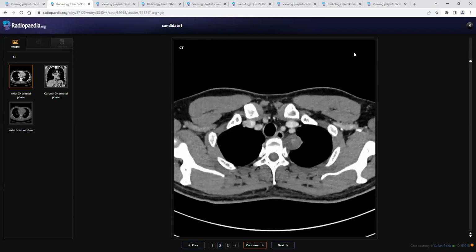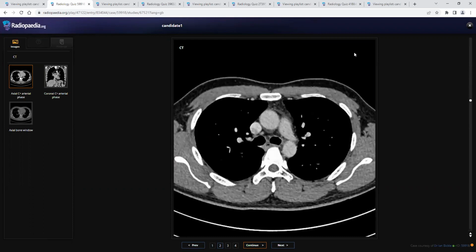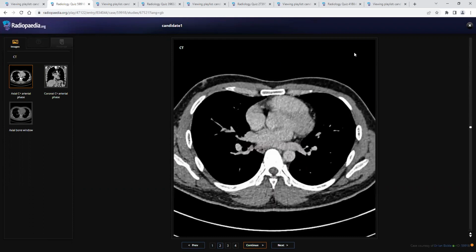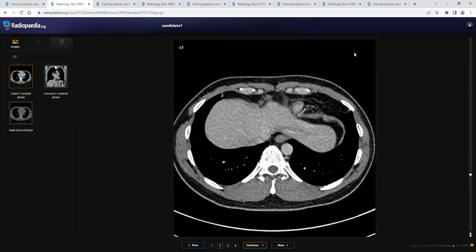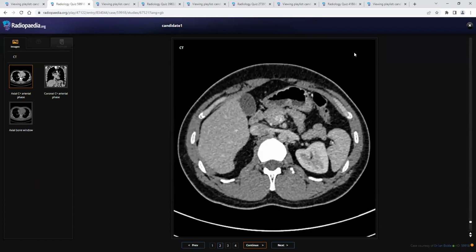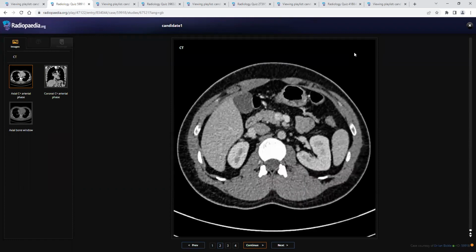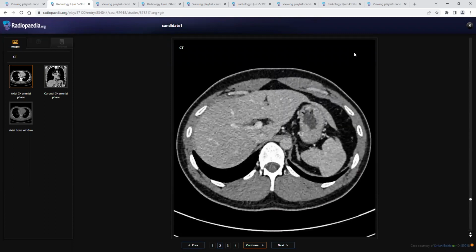However, the possibility of a neurogenic tumor like schwannoma is still the first possibility in patients like that. Another possibility would be extramedullary hematopoiesis. However, it is less likely because there is no evidence of other lesions; it usually comes with more than one lesion.